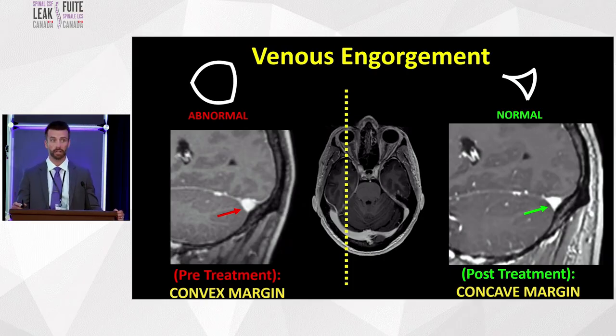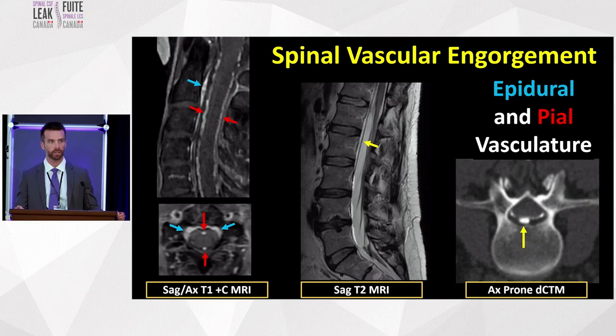But this is incredibly subtle, and depending on where you look at it, it can be very variable. So, practice this, sort of this deliberate practice on patients who don't have, you're not suspecting a leak. Look at everyone's transverse sinus. What do they look like in other cases? I think that could be very useful.